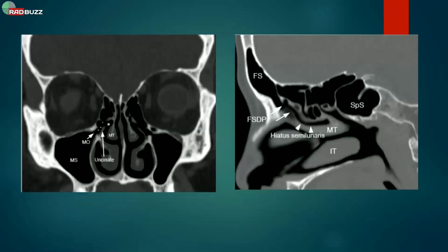Now here we are going to see this one. As I told you before, sagittal, coronal, axial, all the sequences and reformats should be seen when you are reporting paranasal sinus, especially sagittal whenever you see a frontal one. Otherwise, it's fine. Now, I will touch it a little bit later.